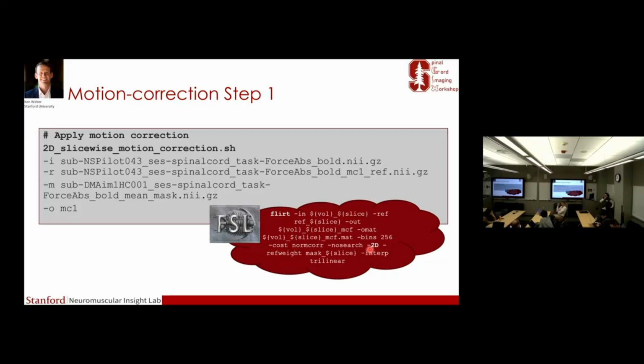This is another area that I think needs optimization, is motion correction, and it's unfortunate because it's one of the first steps that we do, and I think we can do it better. So I'm excited about hearing about the deep learning option that might be available in the near future. But it works fairly well, I feel. I think MCFlirt uses Flirt underneath.